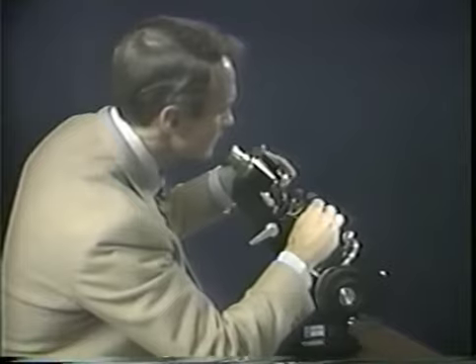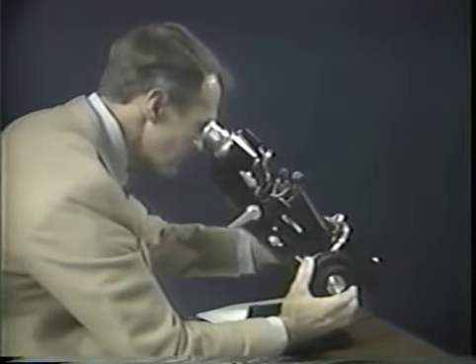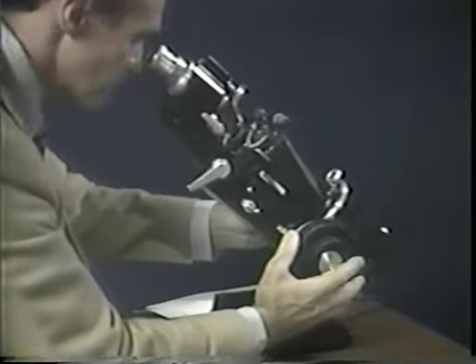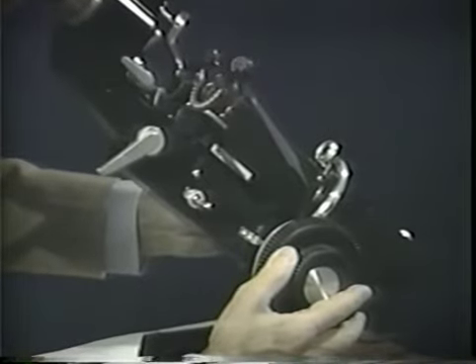If both the over-refraction finding and the patient's old lenses are astigmatic, the two can be added together most conveniently by measuring the resultant combination on an ordinary lens meter. Alternatively, special purpose calculators or computer programs are available to perform the necessary trigonometric calculations.